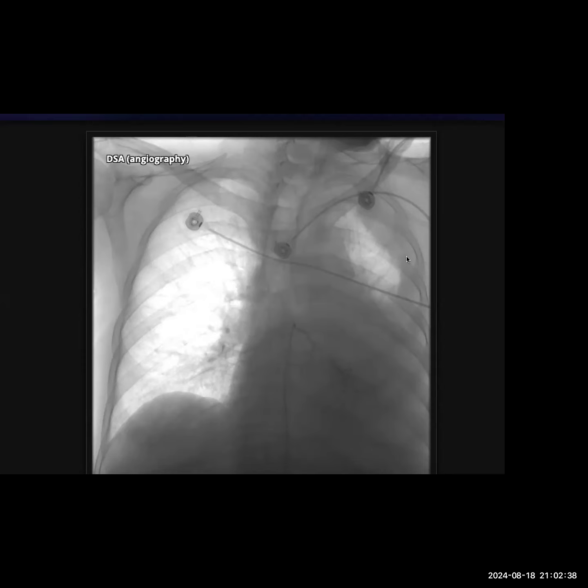Yes, I'm trying to assess that. I think this could be a case of bronchial artery hemorrhage, or a pulmonary artery hemorrhage. Do you think the pulmonary artery caliber fits with this? No, that is not fitting with the pulmonary artery caliber. So I would be thinking in terms of a bronchial artery bleed.